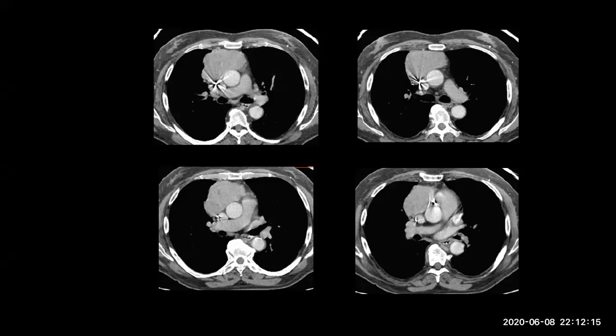And you see here the mass lesion is lobulated, well-defined, and not infiltrating the fatty planes, not associated with lymphadenopathy, no vascular invasion, and no pleural effusion. Negative findings are very important. You must remember to mention them at exam time. Okay?